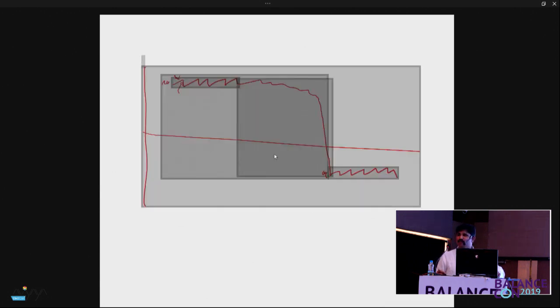Thank you, sir. So when you see this, it looks like this. Somewhere around the 89th second, suddenly it starts. Can you make out? Everyone? So left beating becomes right beating. This is the third direction changing nystagmus after hyperventilation.